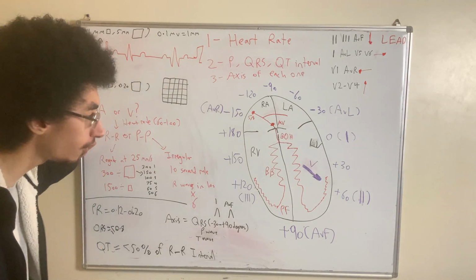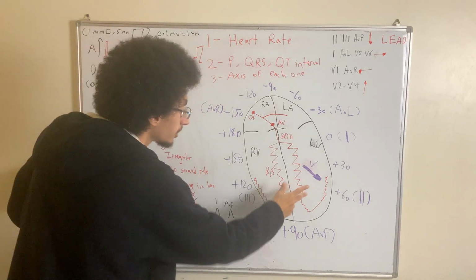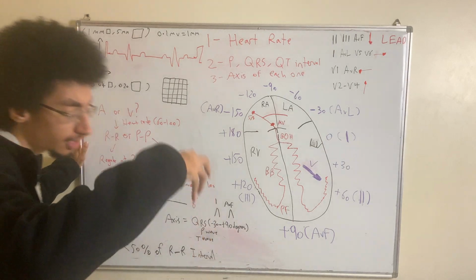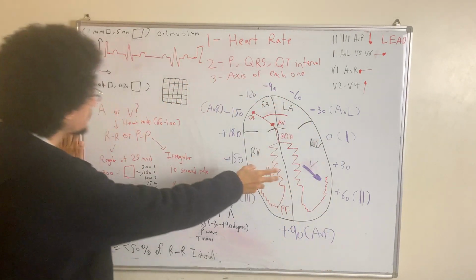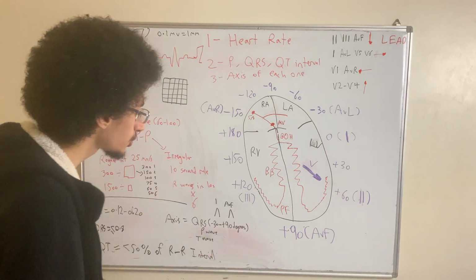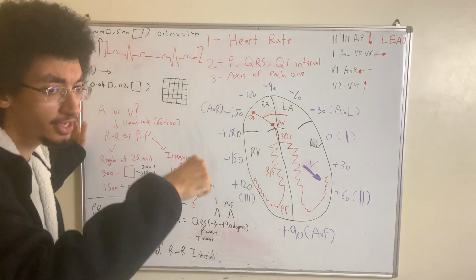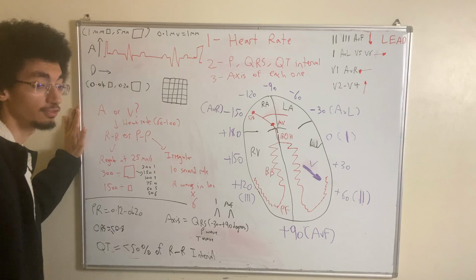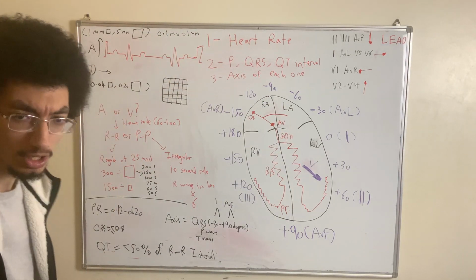As we mentioned before, the R wave represents ventricular depolarization, and the ventricle is so much bigger. So there's a lot of depolarization and a lot of contraction going on as compared to atrial depolarization. So more power. It's natural that the amplitude of the R wave will be greater than the amplitude of the P wave. So it measures the power, and you read it vertically.